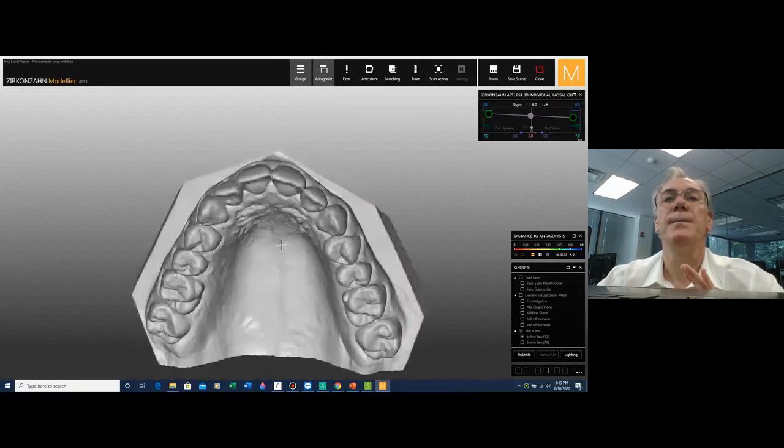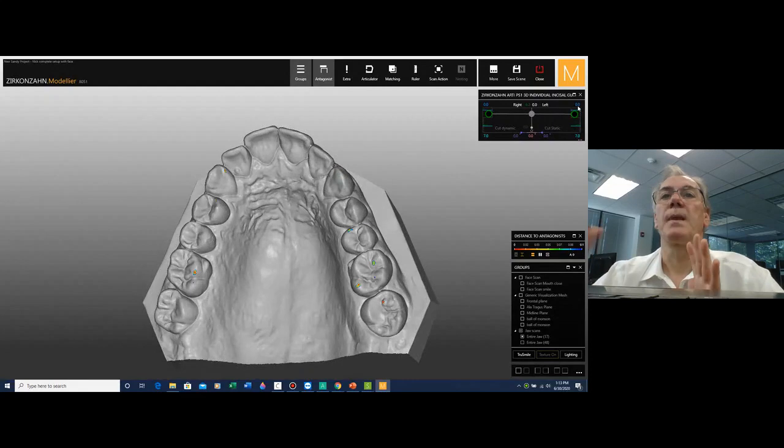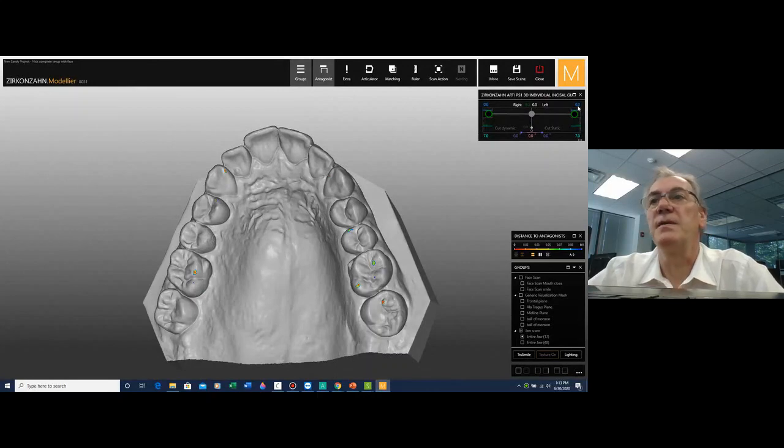And this is what I can say in relation to setting up the models in an articulator with custom values of the patient itself, keeping in consideration the natural head position, which is something that I do understand in prosthetics we haven't been evaluating all that much, but it's a practice often used in ortho, and it's a good thing that we are able to evaluate this natural head position in prosto as well.